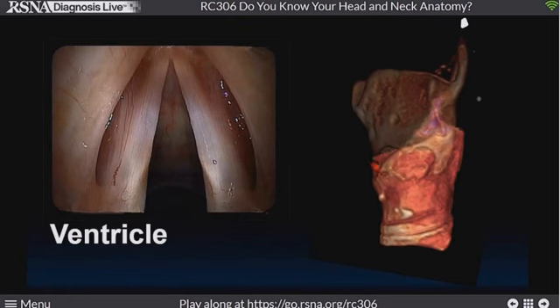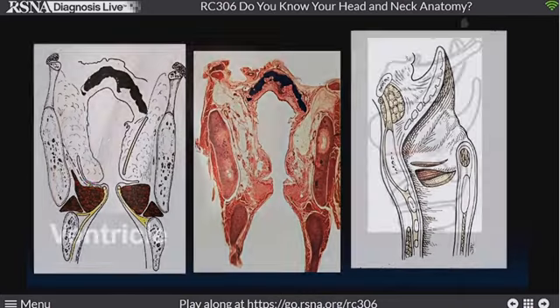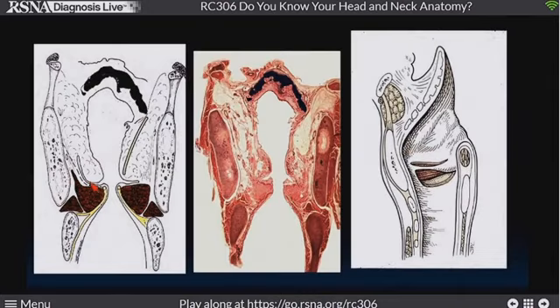How do we find it at imaging? Well, you can use the cartilage. Remember, the cricoarytenoid joint is going to help you, but it's really the soft tissue that will guide us at imaging because it is really fat to muscle, and that is the exact point of change. The cartilages are close. They'll show you where the true chord is. You may be able to figure it out from there, but this is indeed an important transition.